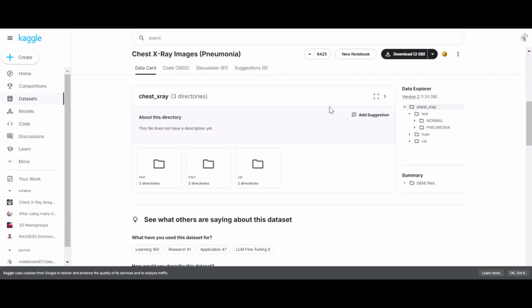Working like this is quite simple and easy. It doesn't occupy your hard disk space, and it requires no calculations from your CPU whatsoever, because you are using an online platform. Of course, you can do it on your local machine. The process is similar. You just have to skip some commands that I'll be using in this Google Colab.